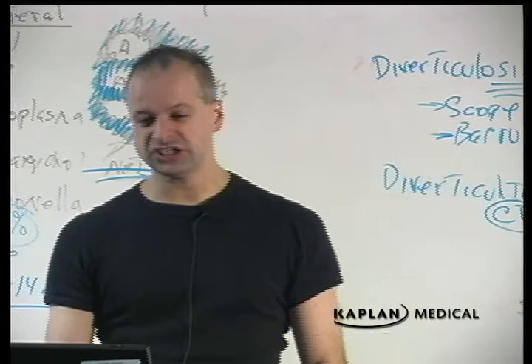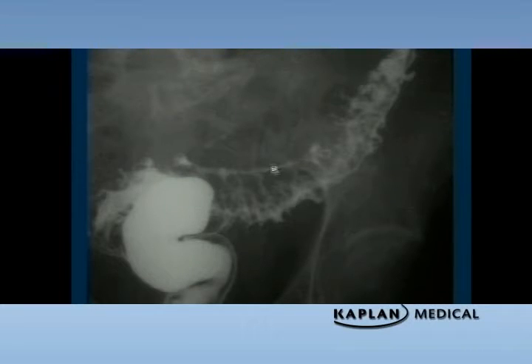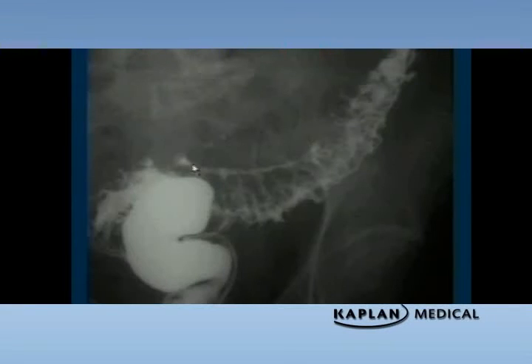So if we look at this image, we see the outside edge of the bowel wall is not smooth. Not like it is in the patient here with inflammatory bowel disease and Crohn's, where the outside edge is smooth. It's the inner part that's abnormal, but the outside edge is smooth. In diverticulosis, the outside edge has these outpocketings that look like solar flares. Here again, diverticulosis. Outpocketings off the side of the bowel looking like solar flares popping off the side of your bowel.